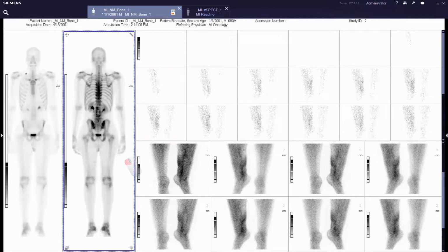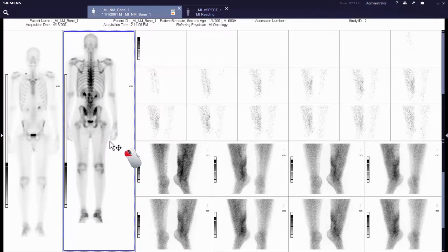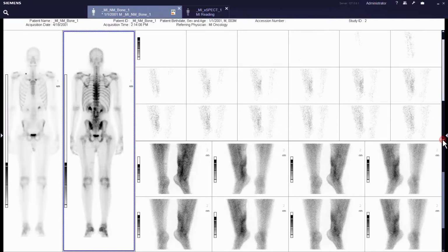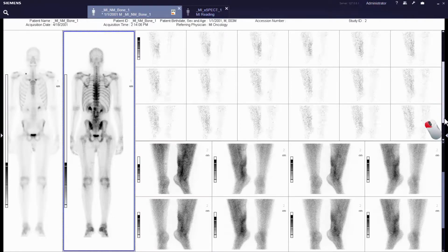When the mouse is moved closer to the center of the segment, you will notice the mouse cursor will now display 4 arrows in a plus configuration. This will allow you to pan the image by holding down the left mouse button. To visualize more of the flow or static data, simply left-click on the down arrow or click and hold the left mouse button and scroll.